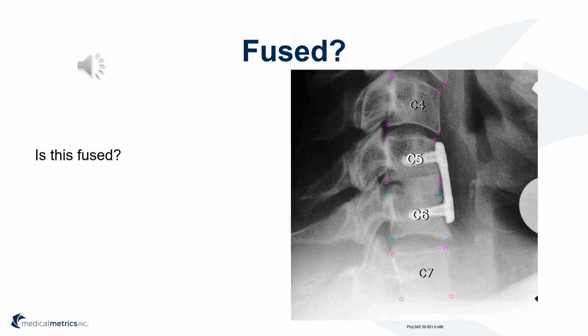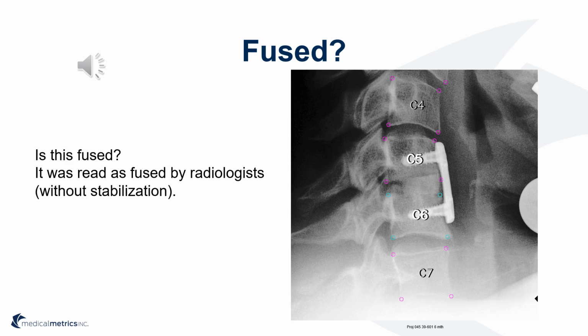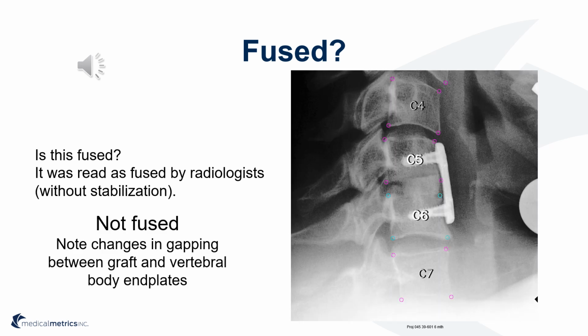Do you think this level is fused? It was read as fused by radiologists who did not use stabilization. However, with stabilization and the quantitative metrics, this level is diagnosed as not fused.